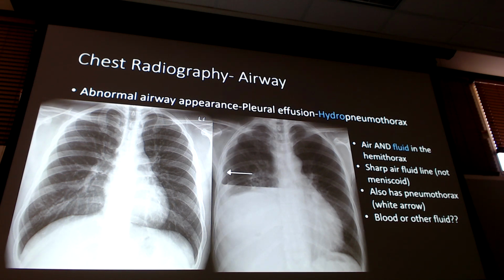If you look very, very closely, you will see a lung line right by that tip of that white arrow, and you'll see no lung markings in black between that arrow and the chest wall. Right in there. That is your pneumothorax. We will look at that more probably tomorrow and break down how to find those.